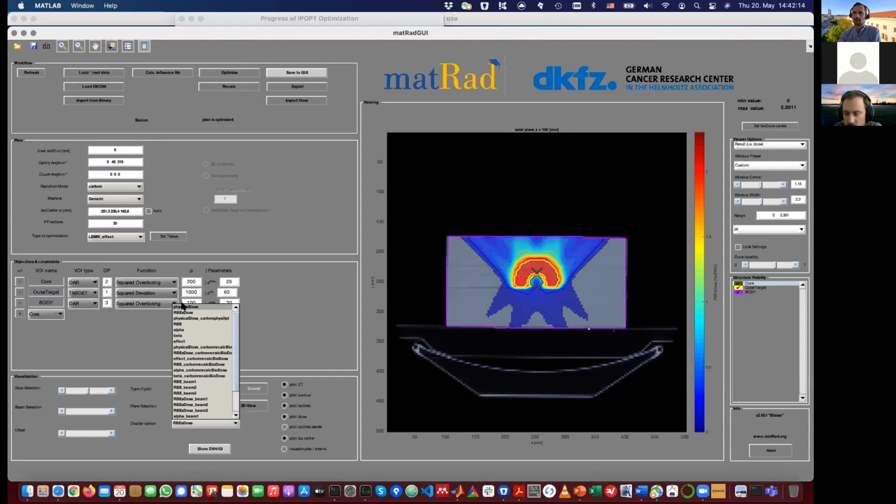So biological optimization now takes care of this problem, and what it does is, the deeper you shoot in, it downregulates the physical dose to compensate for the increased biological effectiveness. And this is something we should see right now. So we should see a higher physical dose on the proximal side, and then it should fall off for deeper tissue sections of the target. And this is actually what we see here.